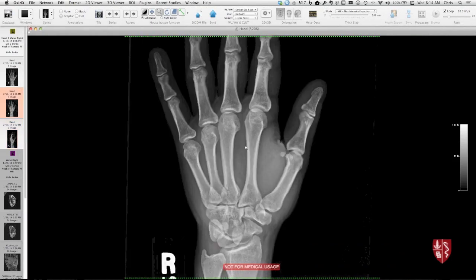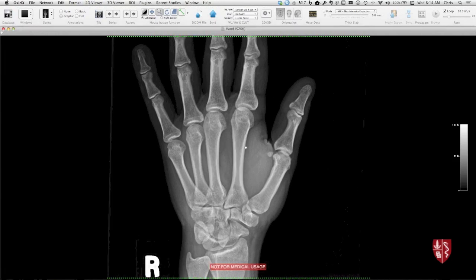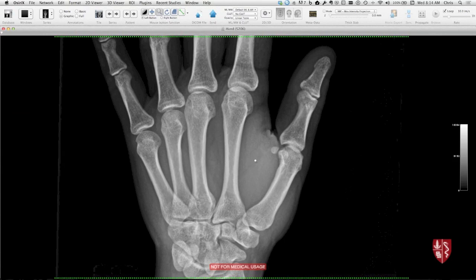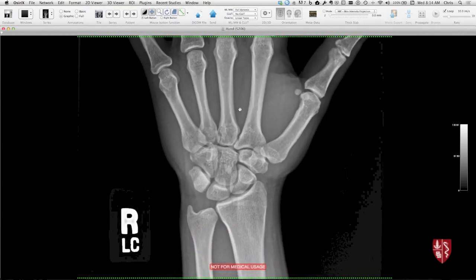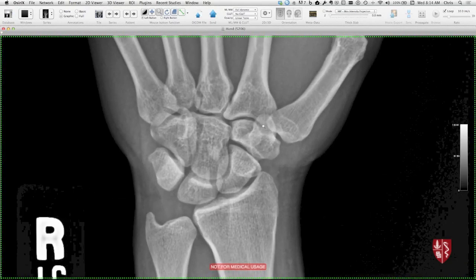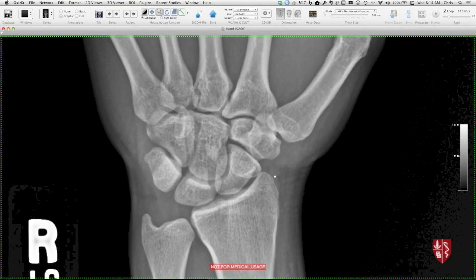This is a shout out to my outstanding colleague, Dr. Kate Stevens, who had this patient come through the emergency department or clinic with wrist pain. And let me show the views here. So here's a pretty good PA view. And things look pretty good, right? Good cartilage spaces. You have scaphoid, lunate. They're overlapping this second arc somewhat, but that can be just because of wrist flexion or extension. Here's a scapholunate interval.